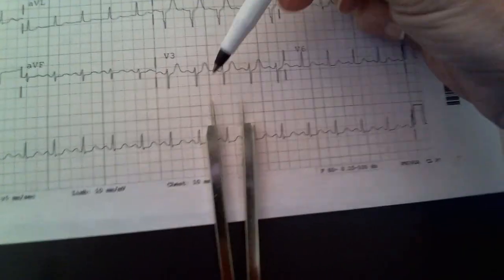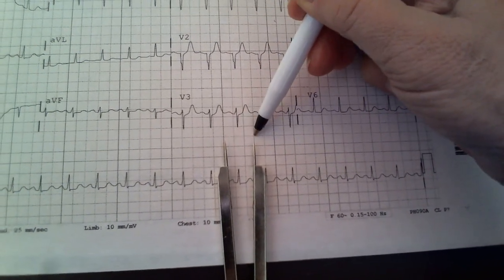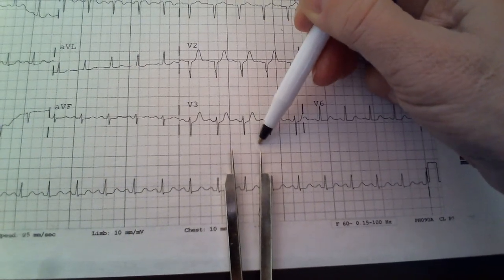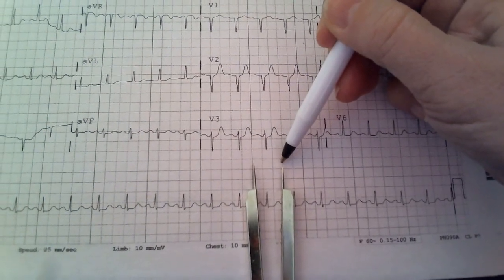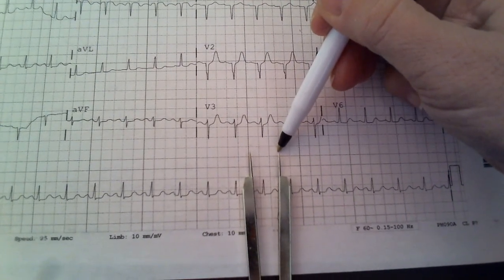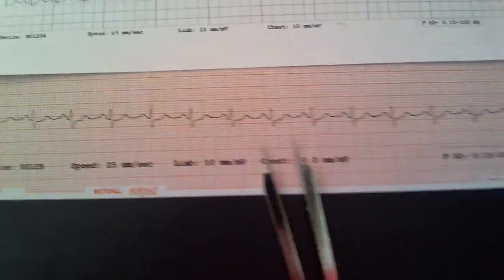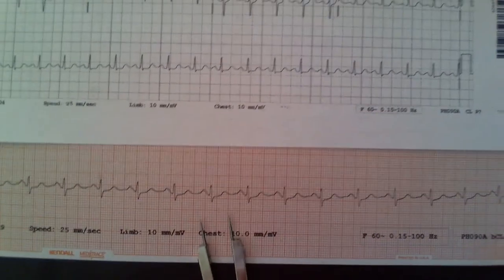So we go back, first box, big box, 300, 150, 100, and one box between 150 and 110 and 100. Each box is worth 10 because 150 minus 100, each is 50 divided by 5, each equals 10. So our heart rate here is 110. And just by looking at this EKG, we can see that it is faster than this EKG because they're both equal in time.